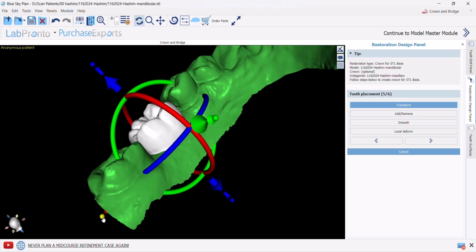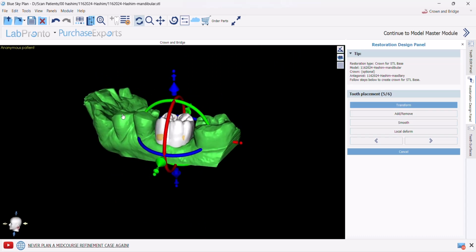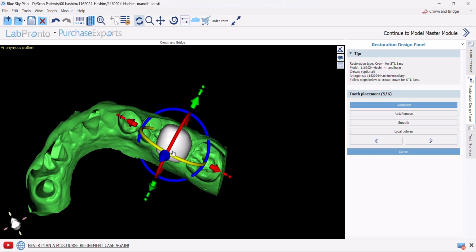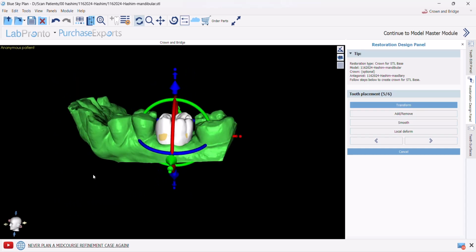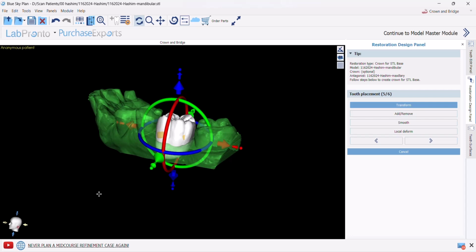Here I'll answer why we selected the scan data, not the cast: because with the scan data, as you can see from underneath, there is no base, so we could see the widgets very clearly. If I want to see the widgets from above, I right-click the mouse button and check Toggle Transparency. Here the model will be transparent, and I can see the widgets clearly.